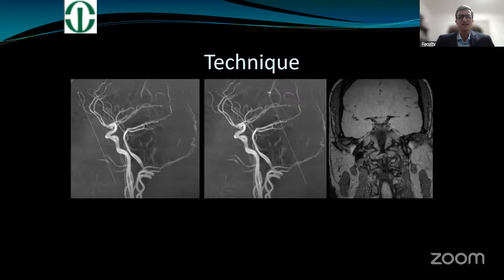Okay, so this is the extent of coverage. If you look at these MIP images, that's as far as the anterior scan goes, and this is as far as the posterior slice goes. Okay, and this is our craniocaudal coverage.